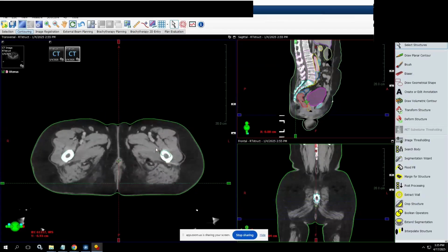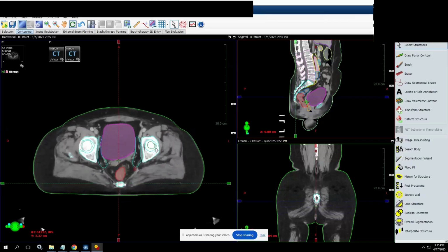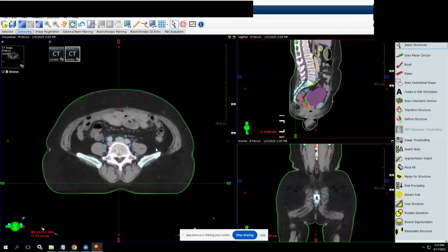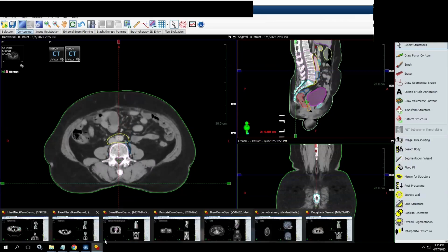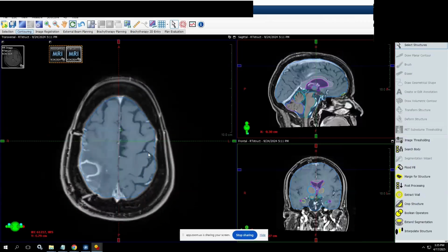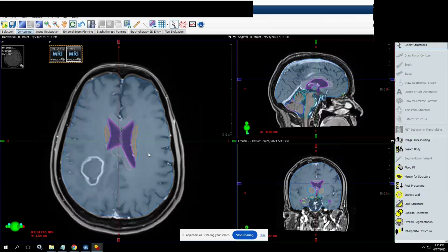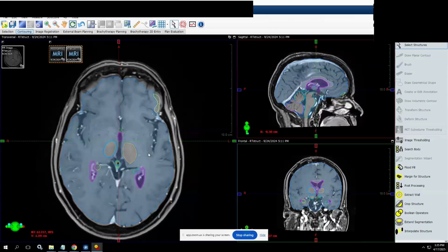Now as we are showing in this, again this shows how flexible our model is. So we can accommodate different types of guidelines and different types of requirements for your model segmentation needs. The next model that we will show you is new. This is something that we have trained over the last week, and this is MRI substructure segmentation, and we demonstrate using this method that our model is capable of doing multimodality segmentation.